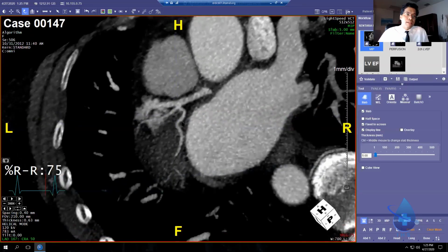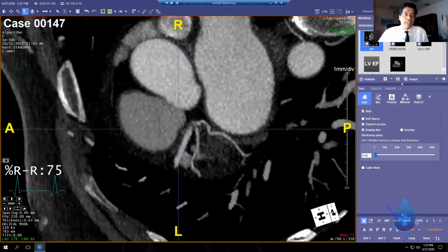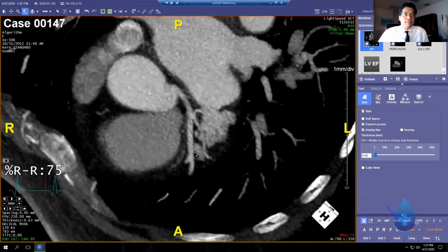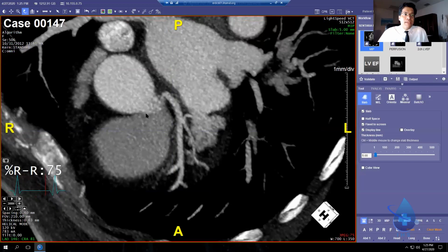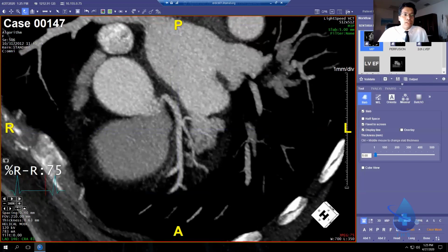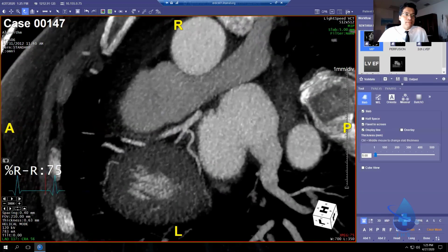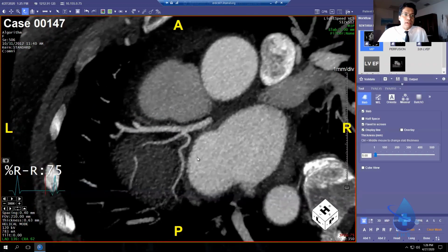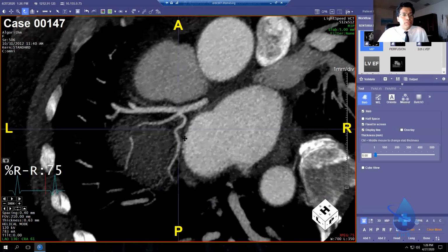circ. What I did without thinking, I should actually go back and do it by articulating what I'm doing. I recognize that the interventricular groove is north and south along the crosshair, and the AV groove is horizontal to that. So all I did was reason that I want the AV groove now lined up north and south. So I left click along the bottom of the screen, and I make the circumflex now north and south along the crosshair. That's the way my brain works. There's no theoretical reason why. It's just the method I've developed to keep the grooves lined up north and south.